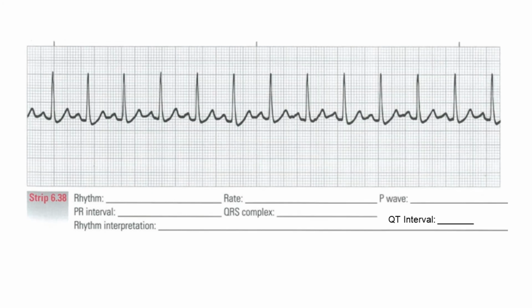In this strip, 6.38, the rhythm is considered regular. You have a heart rate of 106.